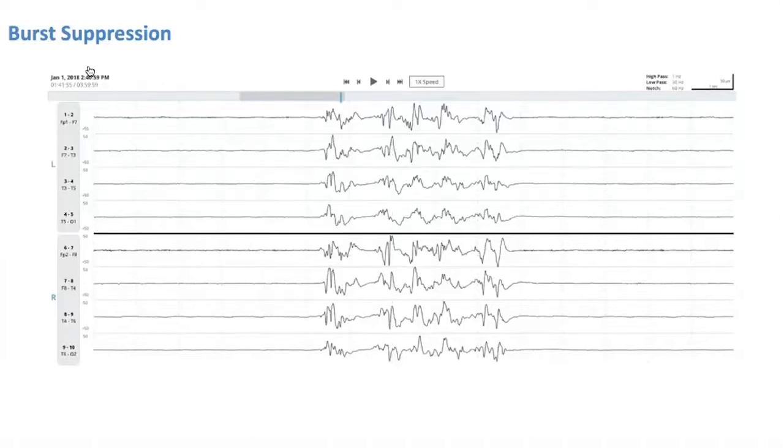I think to maybe bring this to some people who are new to EEG, we can use the analogy to the EKG, that when you see in the EKG the same QRS complex over and over again, and that complex has the shape that's familiar to you, that's relaxing, that's relieving. When the complex varies each time, that raises concern for an arrhythmia of the heart.